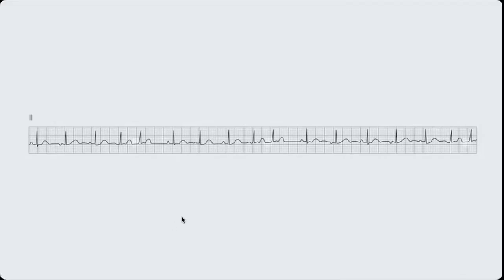And lastly, normocardia, tachycardia or bradycardia? Again, it's 25 millimeters per second. It's calibrated. It's a 10-second rhythm strip. It's a tachycardia. That's correct. So here for our rhythm analysis, we describe it as an irregularly irregular, narrow complex tachycardia of 102 beats per minute. Now we're going to go on to the P waves.